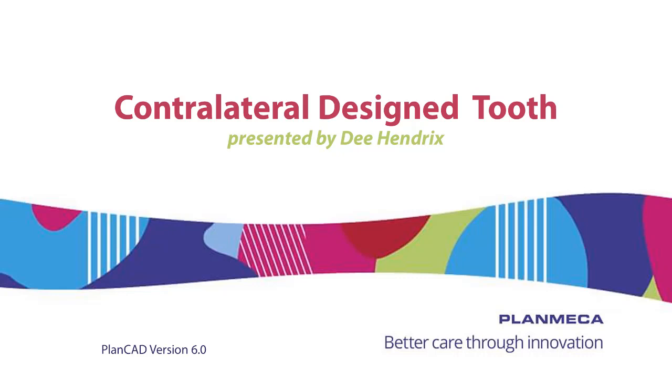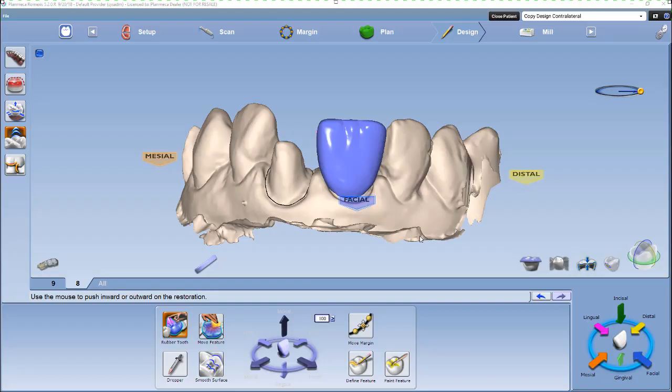Today's video, Contralateral from Design Tooth. When doing a contralateral from design, you want to go ahead and design the first tooth that you're working on. In this video we are working on tooth number 8, so I went ahead and designed tooth number 8. Now we want to use tooth number 8 and put the contralateral of 8 onto 9.